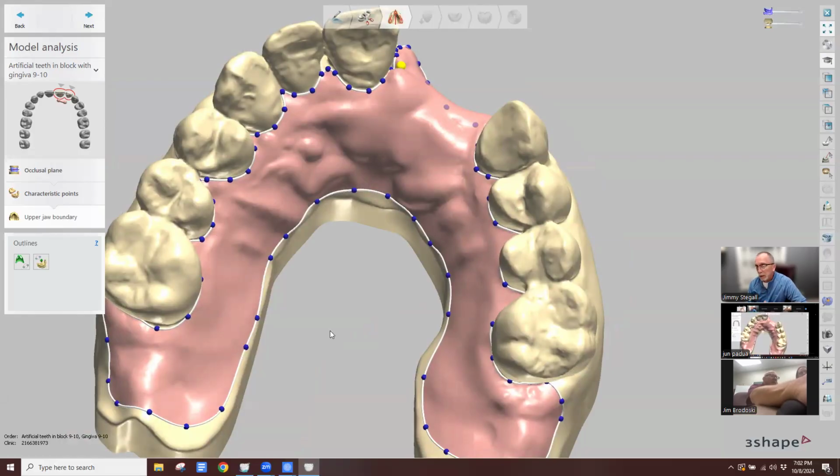I had fewer teeth, and I was worried about having enough retention with just the lingual embrasure retention. We're going to put a wire in this thing, and what I would have done is I would have taken the model and bent the wire first, put it on the model, scanned the model with the wire in place, and then come to this step.